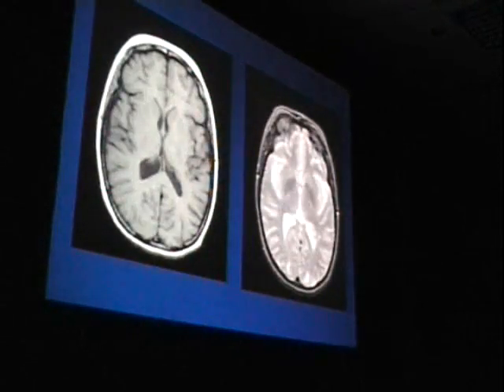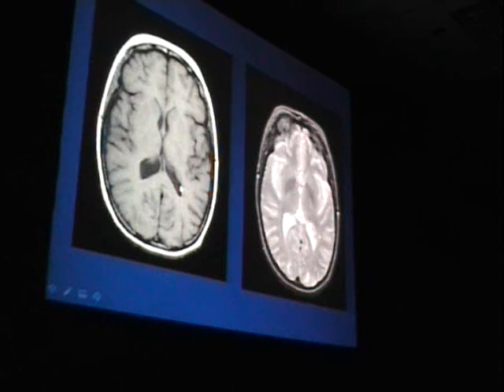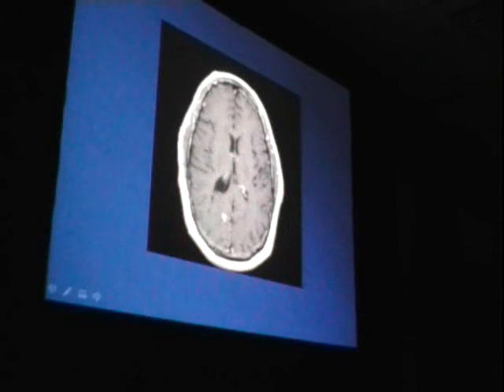Okay, so these are adults with essentially the same diagnosis, all presenting with seizures. A non-contrast T1 and a T2 weighted image. And you can see this subtle alteration of the lateral ventricle on the left side, which corresponds in a slightly more inferior image with these slightly iso-intense structures which indent the outer aspect of the ventricular surface. And this is another patient, a contrast-enhanced study, which again shows a similar nodular indentation along the atrium of the right lateral ventricle.